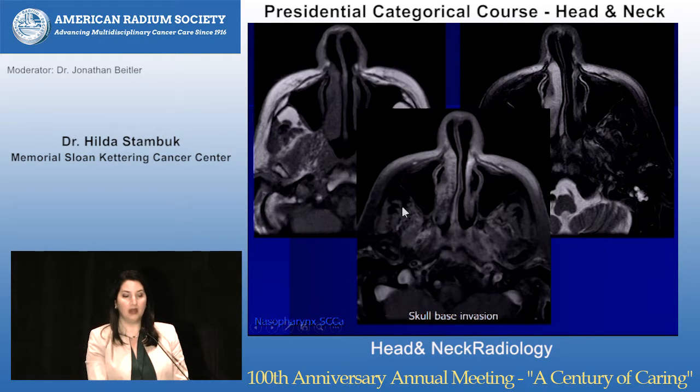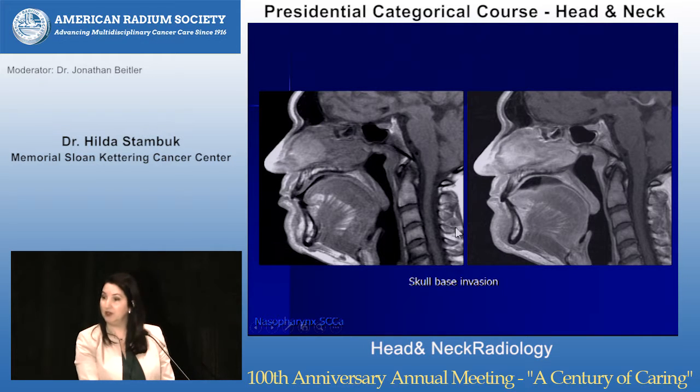Well, look at this right here. You can see that the subcutaneous fat ventrally did not suppress, but it did out laterally, so there's incomplete, inhomogeneous suppression. So what if this patient's tumor and what if the bone back here didn't suppress well? I might overcall bone invasion when it didn't exist. So post-contrast fat-SAT is nice, but I really like the pre-contrast T1 for bone invasion.